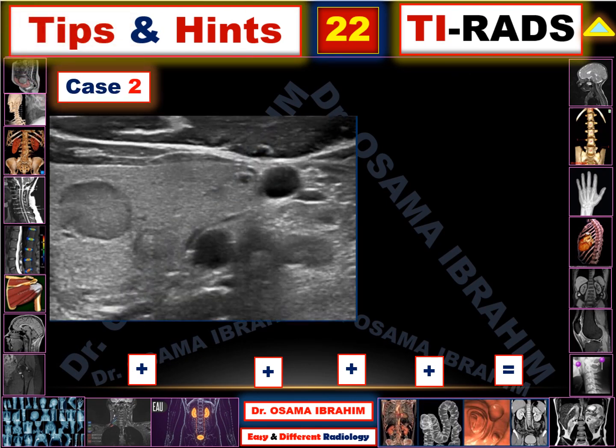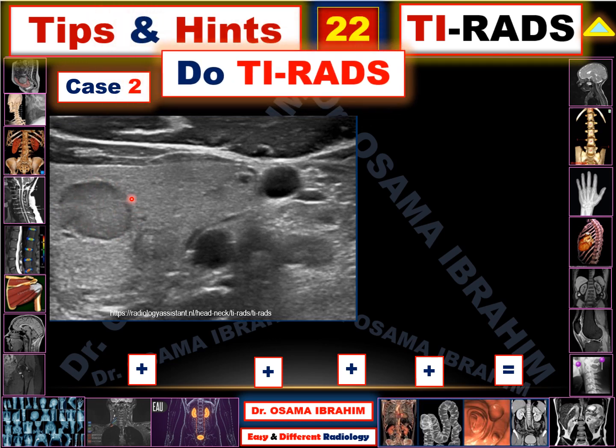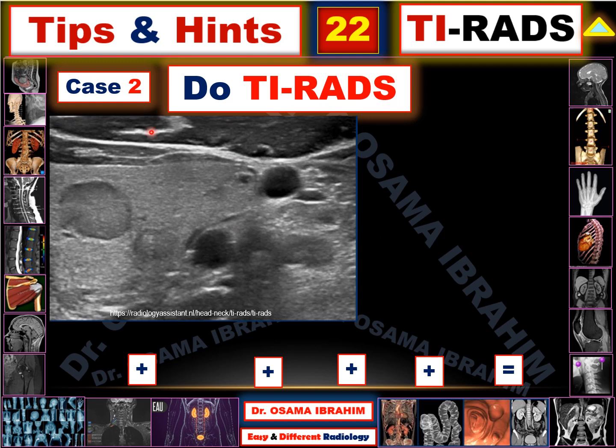Case 2, this nodule. You can describe it according to the 5 categories. I will give you 10 seconds. After 10 seconds, do the TI-RADS and give the recommendation.